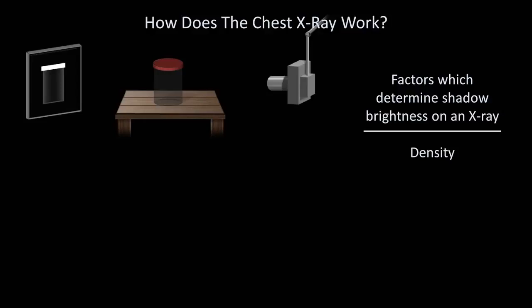Since air has a very low density, X-rays easily pass through the jar, and thus the jar appears empty on the film. Note that the metal lid has blocked nearly all of the X-rays, which has left a sharply demarcated rectangular patch of white unexposed film.